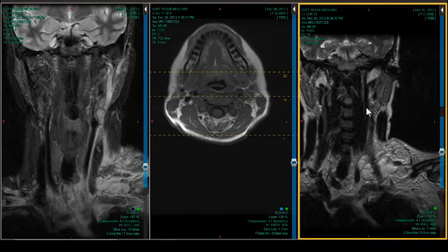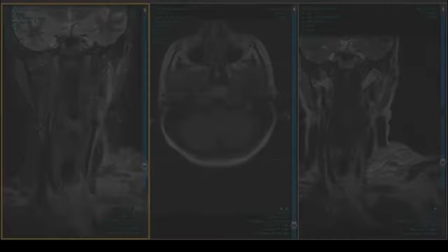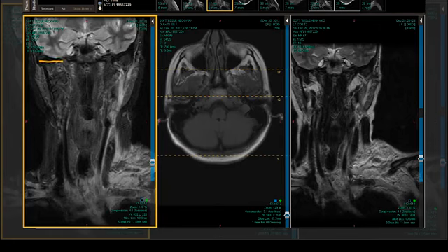So in other words, when the blood first becomes a clot, it's going to be gray on T1, and it's going to be bright on T2, and that's what we've got. And then as time goes on, it's going to become brighter and brighter on T1. We'll call this T1. And it's going to get less and less bright on T2, and then eventually it's going to invert on T2.